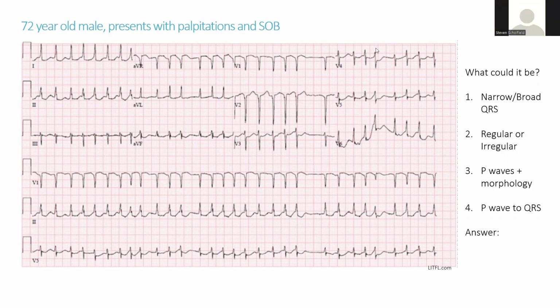Had a few suggestions in the chat already, Tim, and someone's just asked a question about lead 1. They're asking, is that not a P wave, or are they mixing it with a T? You're probably talking about this thing here. Lead 1, not V1. Okay, lead 1. You're right, it's hard, isn't it? At first I would probably say that is a T.